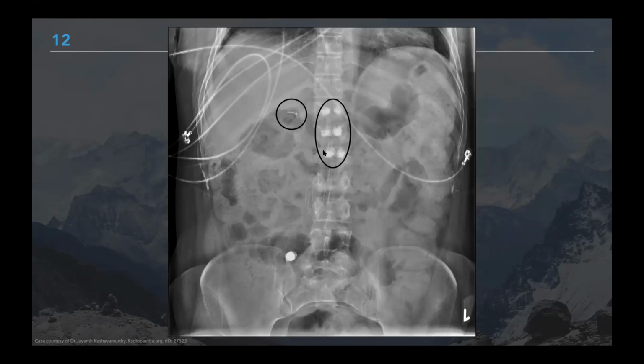You've probably also spotted this. So in your densities part of your review, you'll look at the bones and you'll see there are these hyperdense, fluffy abnormalities in the vertebral bodies. And this is vertebroplasty or kyphoplasty. It's a way of treating osteoporotic vertebral fractures. And you inject this cement essentially into the vertebral bodies to prop them up.